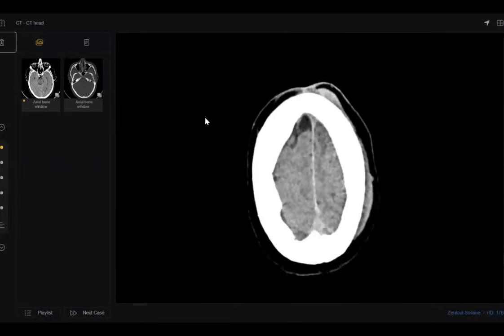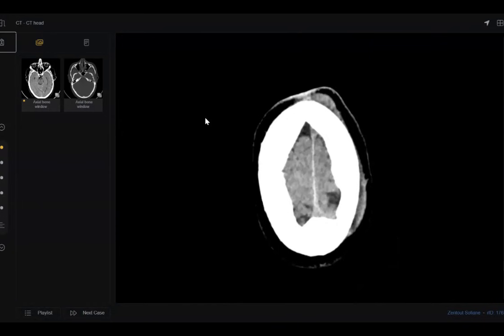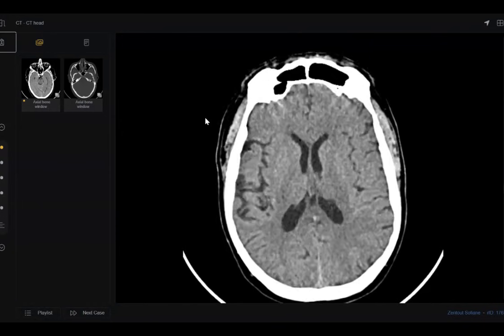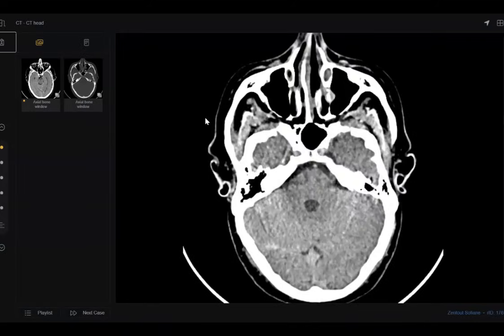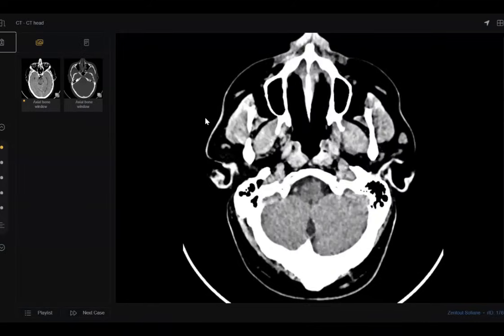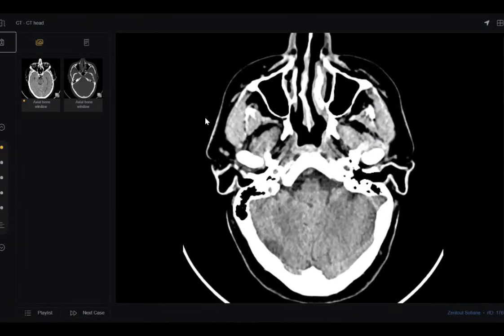What do you think? Contrast or non-contrast? I don't see the peripheral vessels, but yes, the MCA, and I can see the atherosclerotic calcifications very well in the petrous segment of the ICA. Yes, so I think it's non-contrast.